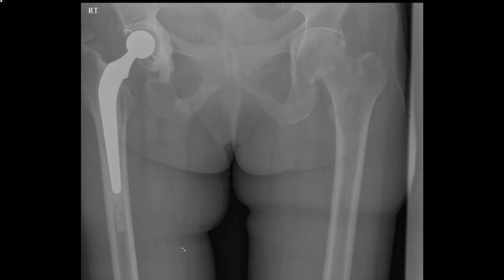She attended for a second injury sometime later, and again the history said query fractured neck of femur. Well, she hasn't fractured the neck of femur, she has a femoral prosthesis. Dislocation of a prosthesis is a common complication. However, this is not dislocated. You can see the artificial femoral head sitting nicely within the formed acetabulum, so there's no dislocation.